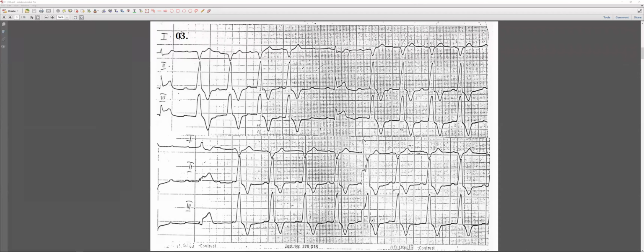A fusion beat is not narrow. A fusion beat means that the ventricle is activated from the ventricular ectopic center plus the supraventricular areas. This is why you see an additional shaped QRS complex. It's not a pure supraventricular beat, and it's not following the picture of a pure ventricular beat, because some part of the ventricle was activated through the normal conducting system, and some other part through the muscle. Okay, thank you. You're welcome.